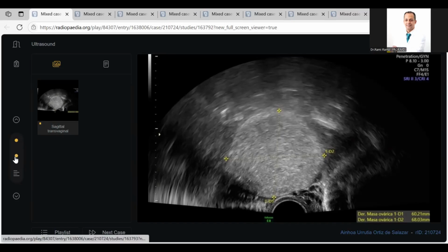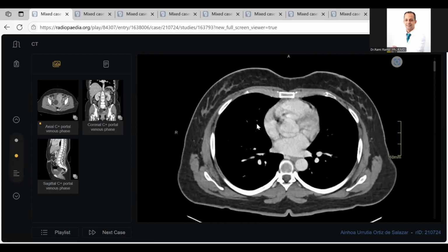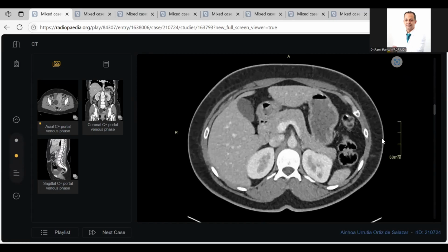Leave the mouse, please. Sorry. This is CT. Yeah, go on.